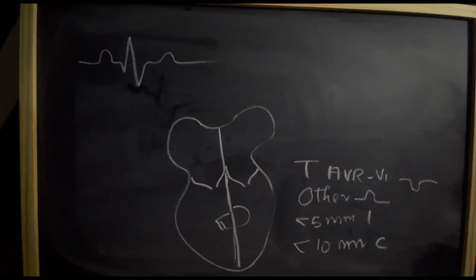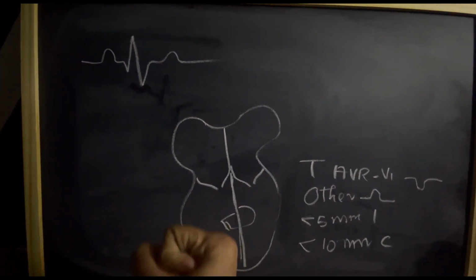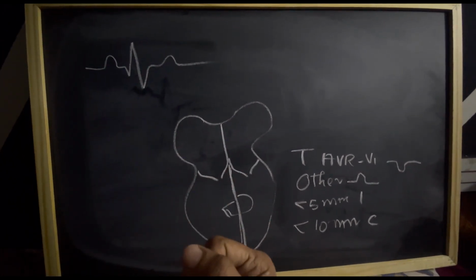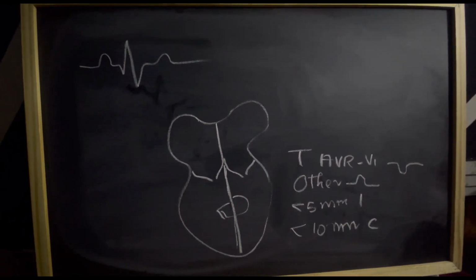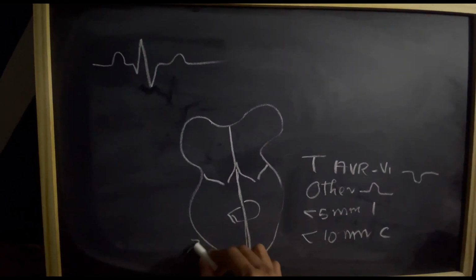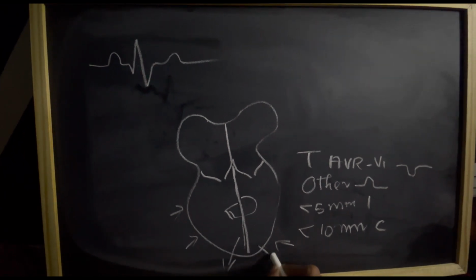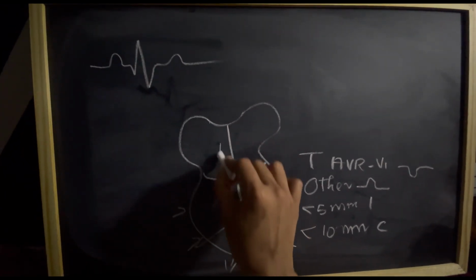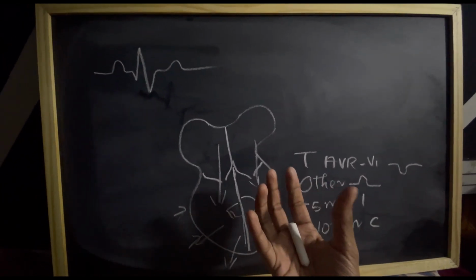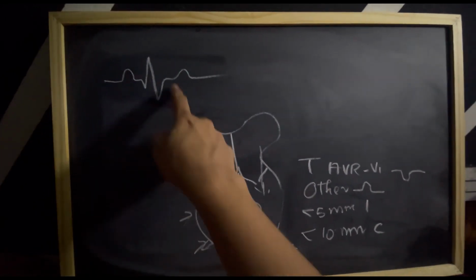Next, we are going to discuss the T wave. After the contraction, the ventricle should relax, which allows the refilling of blood. Once the ventricle has contracted, it should come back to normal size and relax to receive blood from the atria. So the ventricular relaxation, which allows the refilling of the blood, is represented by this T wave.